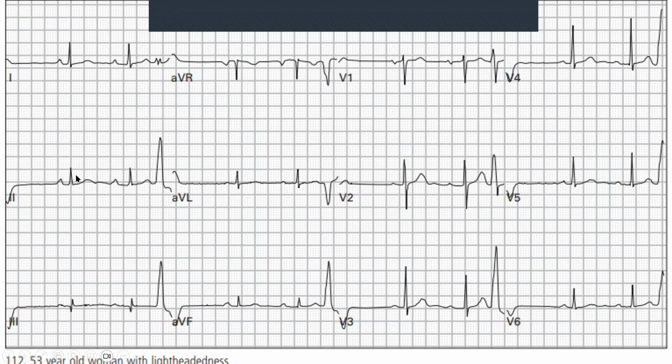Okay, then we look at our QRS complexes. Are they narrow or wide? They're narrow. All right, except for these ones. Okay, but we'll get to that just now. Are they regular? No, they're not regular, because in between you've got these beats that are coming out. All right. Okay. And does it occur regularly? It doesn't occur regularly. So this is a rhythm disturbance. Right, so we've got a rhythm disturbance.